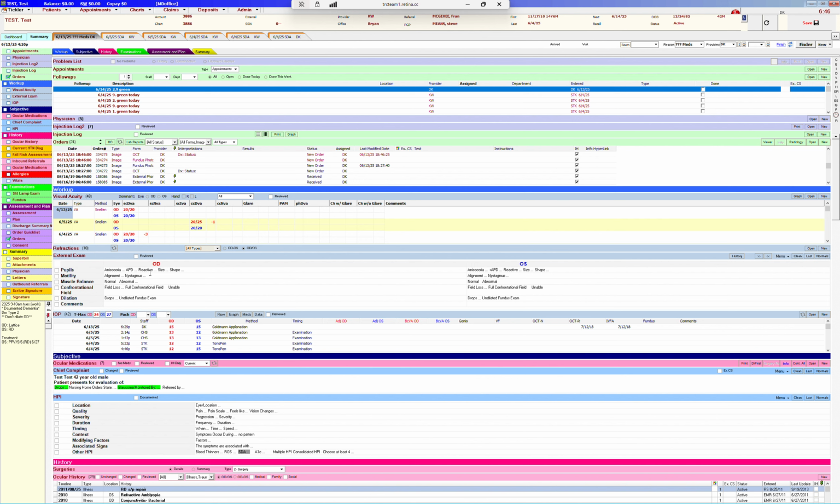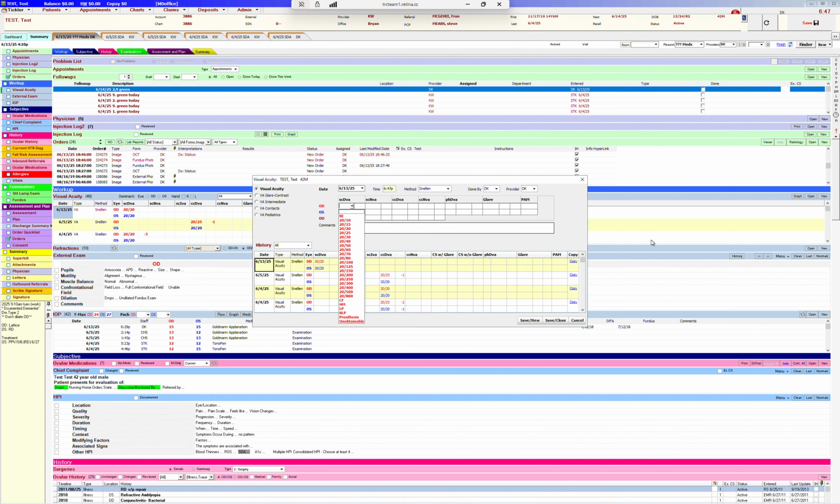So we will do the visual acuity first. You'll take visual acuity like we indicated with the occluder, and we'll get a visual acuity for both eyes. To enter that value, you'll click new, and a box will appear.